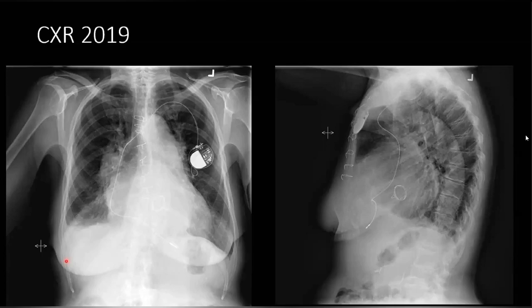Okay. Now what do you think? So in this radiograph, in this X-ray, I can appreciate that the sternotomy sutures are seen. Moreover, a cardiac pacemaker is seen with its lead in the right atrium. It is normally placed. And just to correct you over here, don't say pacemaker.